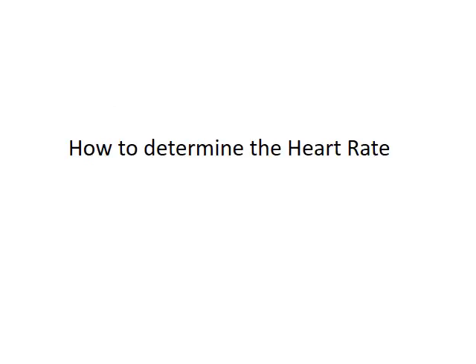How can we determine the heart rate? Now, in most ECG printouts, the machine will calculate a rate, but we need to be in the habit of calculating this ourselves. Once we've learned some of these techniques, it only takes a few seconds to work out.